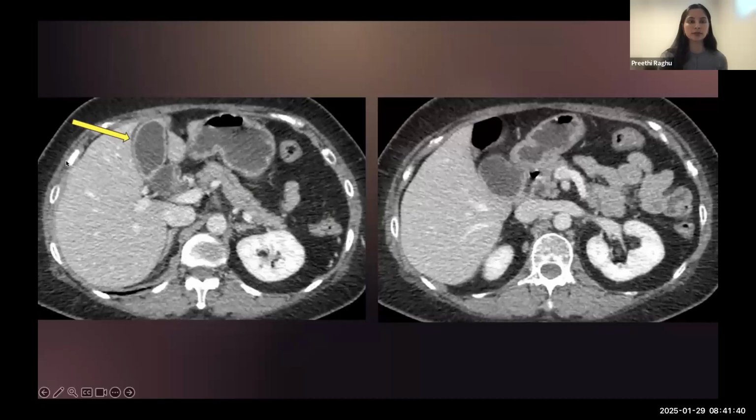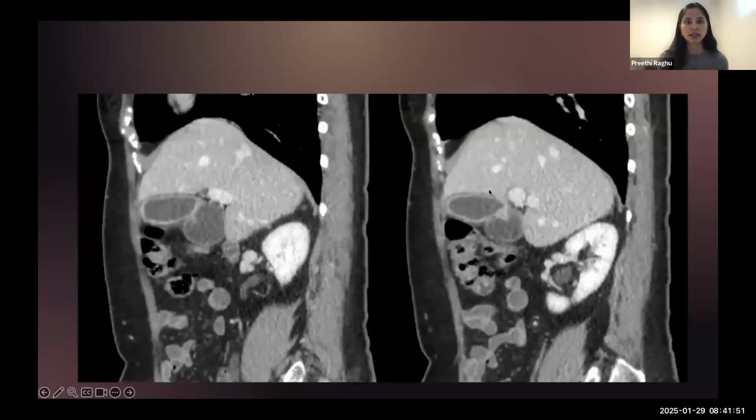This was another patient who had been told that they had gallbladder cancer based on an outside CT. And this was a CT where we see something that looks like gallbladder, has this mucosal hyperenhancement, and we see something else that looks like gallbladder that doesn't have that same type of wall enhancement. And then I think the key here is to see that between those two structures is this little enhancing, what looks like a little bridge connecting the two.